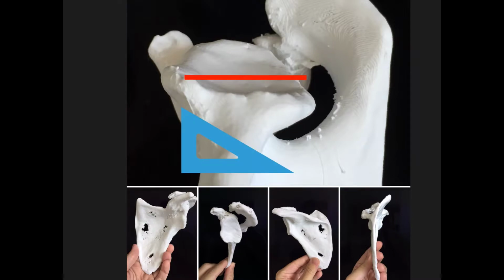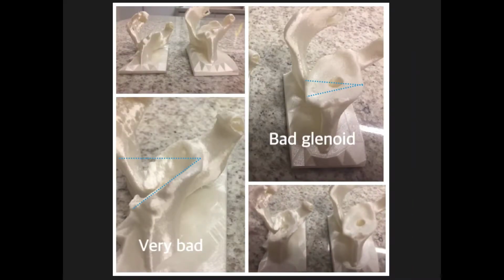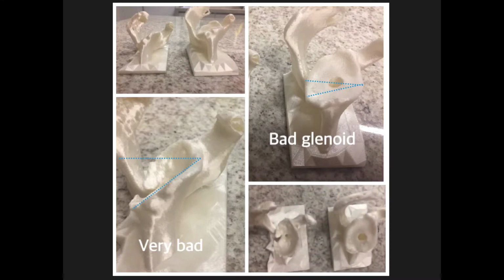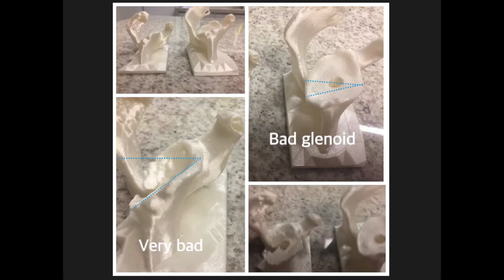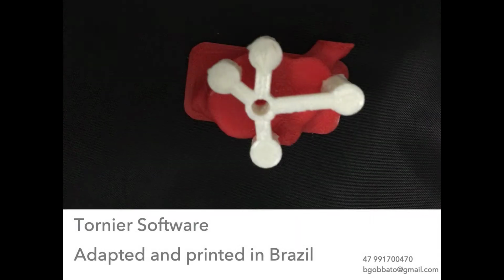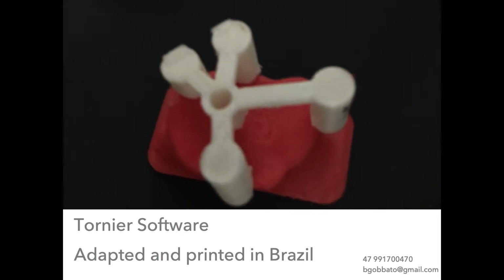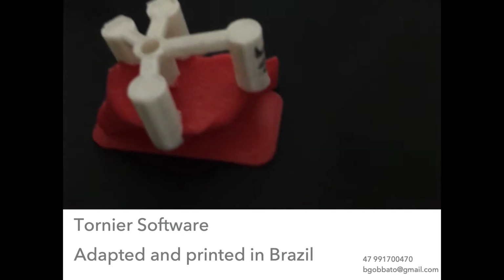Sometimes we have some retroversion and some inclination, like this case, and sometimes we have some bad glenoids and some very bad glenoids, like this example. Here are some examples. This is one type of guide, one type of planning that we made through the Tornier software.